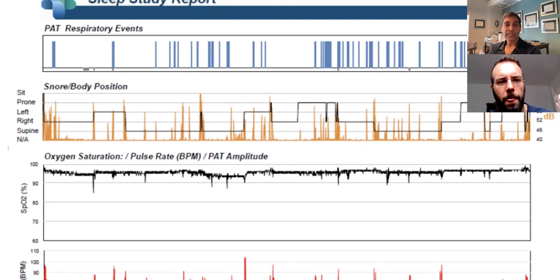Anyway, hopping over here, yes, the patient's sleep is kinetic, and there is a little bit of steady snoring, but also small clusters here, here, here, here, here. Sleep apnea occurs in clusters, and it's kind of strange. You can have the same fixed small airway, but regardless, it comes in clusters.